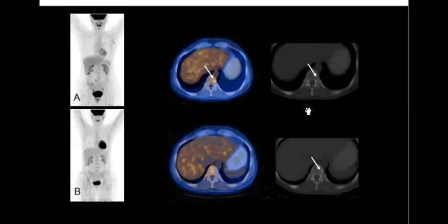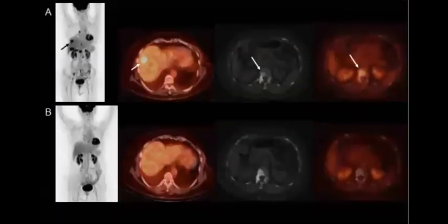Okay? And in the CT, you will find some sclerosis. So this means that it is going to heal. Okay? Healing. It's a good response, and this patient has healing. So back to this case again, because maybe you can see that the metabolic response is high here. Then here it's gone, you don't see it.